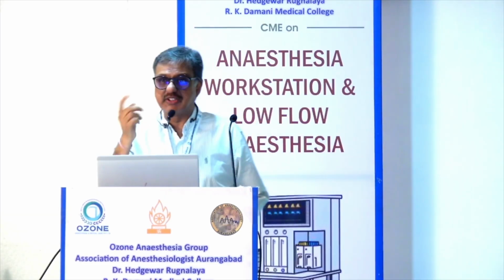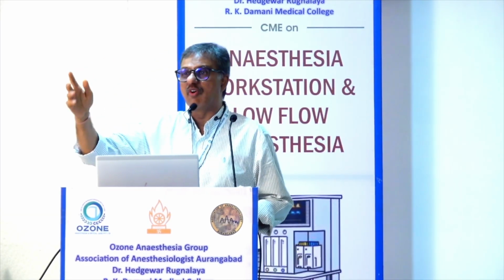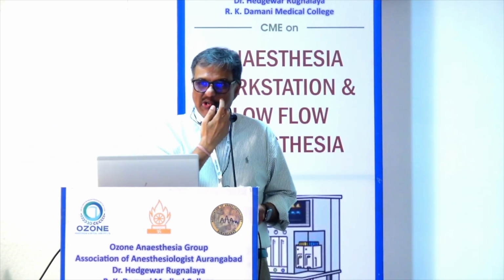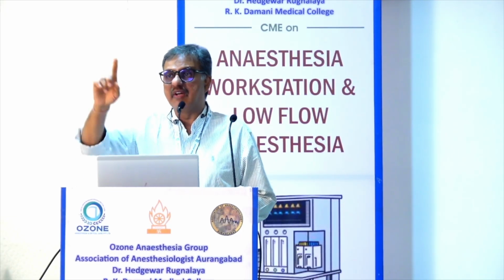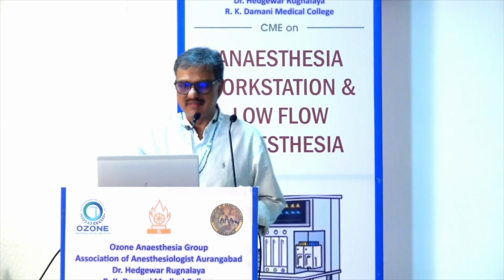And we are able to achieve the end-tidal, alveolar and brain concentration in almost the same time. Absolutely the same. So this is how you can change your practice, where you can start with lower flow and higher dial concentration to reduce the wastage. But when you are using nitrous, no low flow for 10 minutes. Yes, it is only with air.